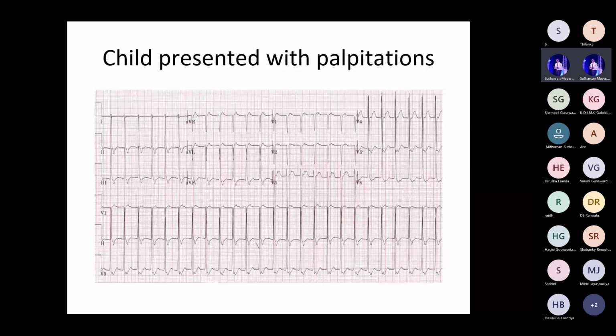Child presented with palpitations. Okay, what's the diagnosis? Tell these people online. Actually, here it's very clear. If you go to V5, the lowest lead, concentrate on the lowest lead. It's obvious anyway. What is this? Palpitations.